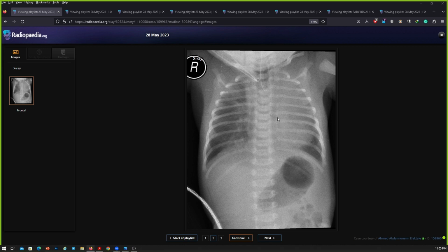Yes, apart from that, I can also appreciate that there is a gross cardiomegaly. So the echocardiographic correlation is suggested to rule out any cardiac defects. And I cannot appreciate the right humerus fully, so I'm not sure whether it is present or absent, which I would like to confirm if there are any other orthogonal views present. Another thing is that I would like to see the lateral radiograph of the spine if it is available to ascertain whether there are any other vertebral anomalies at the level of the sacrum and pelvis. And all these would then constitute the VACTERL spectrum, and for that purpose further evaluation of this patient is suggested. I would like to inform my findings to the pediatrician, and further management and follow-up imaging as suggested can be performed.